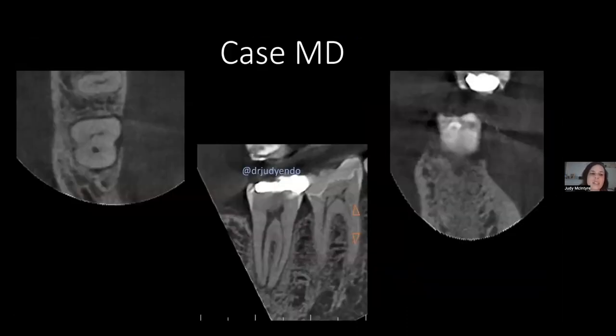Now let's progress a little bit. So on my CBCT scan, so different case here, this patient came and the CBCT showed a deeper angular defect. Now, this is the sagittal, this is the coronal, and you can see that the bone in between teeth should be uniformly across on the coronal, okay? Here, it divots because that's corresponding to that defect.